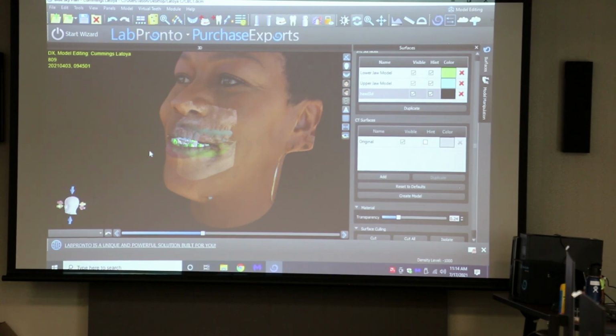Next. You know, him and his wife came in and we went through this stuff. It depends on the patient, what they need. And next. Alright, so every patient is different, that's okay. I can't remember how I got out. Make this bigger. Okay, and if you then go to surfaces, model manipulation, actually it's not surfaces.